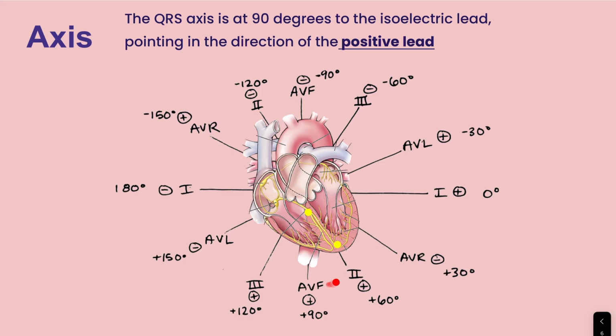This is all that bulk of the left ventricle. If our flow is going to the bulk of the left ventricle, that's what we physiologically would expect, right? The left ventricle tends to be larger than the right side in a healthy population. It has to pump to a larger area. We know that it's a bulkier side.